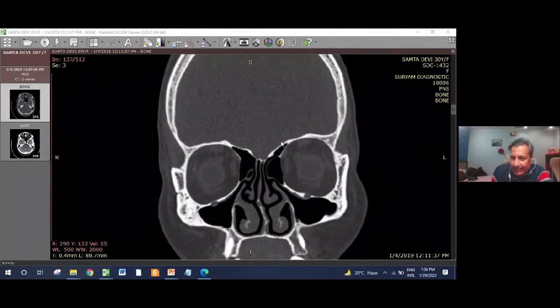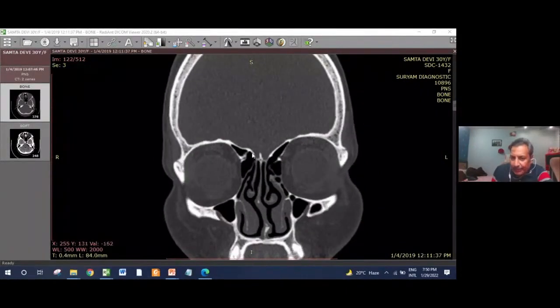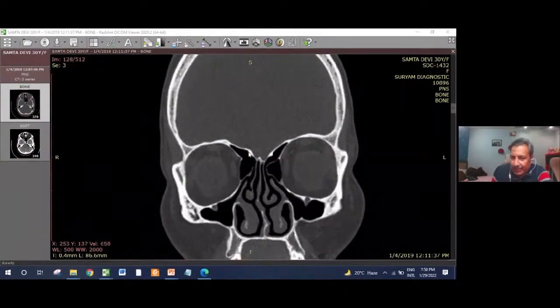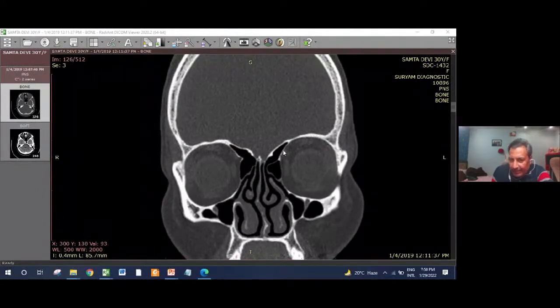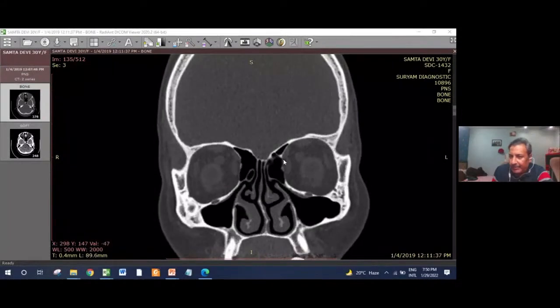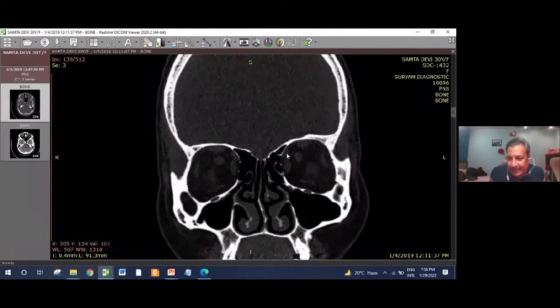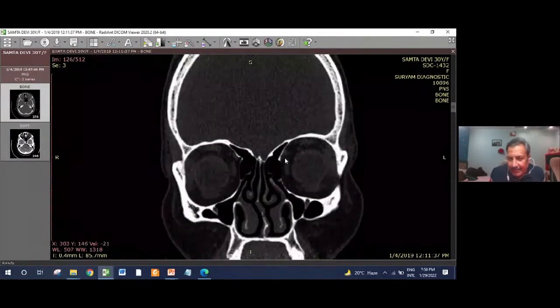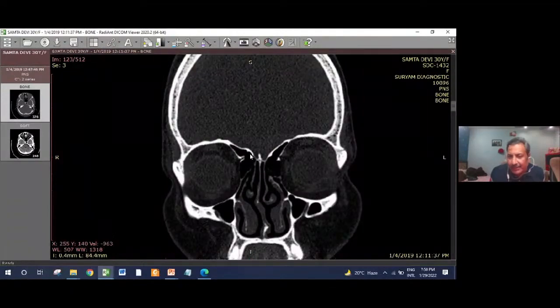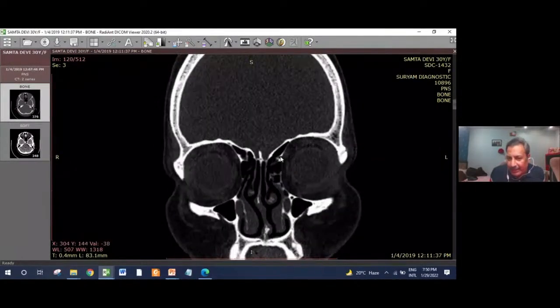Anterior was the thin anterior ethmoidal roof, that is the cribriform plate, and before the cribriform disappears, what you get is coning of the orbit. See, the coning of the orbit, depending upon the pneumatization of the anterior ethmoid. This coning of the orbit, what is that coning? This coning demarcates the exit of the anterior ethmoidal artery from the orbit. This shows the exit of the anterior ethmoidal artery from the orbit.